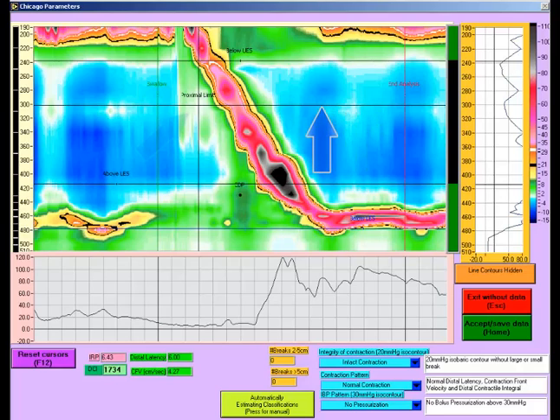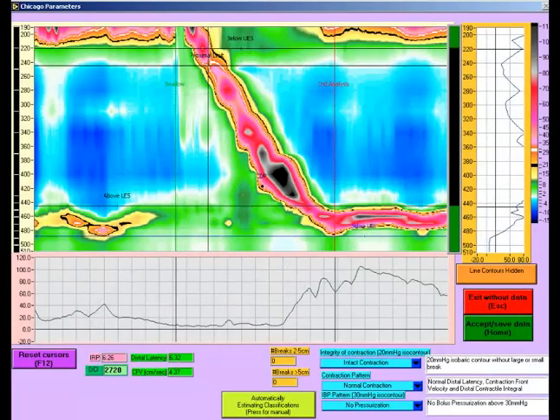The crosshairs marked proximal limit should be moved to the earliest part of the 30 mm of mercury contour at the proximal end of the smooth muscle esophageal contraction. The point marked CDP should be moved to the junction of the tangents between the 30 mm of mercury contraction front and the slower contraction of the phrenic ampulla. An example of cursor placement is shown here.